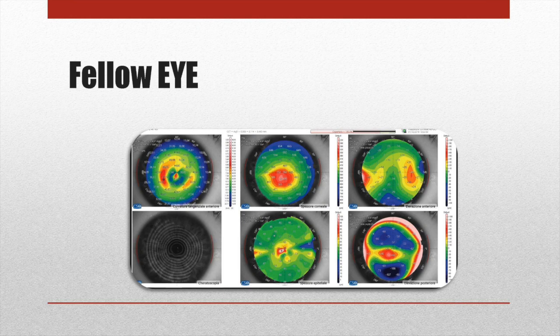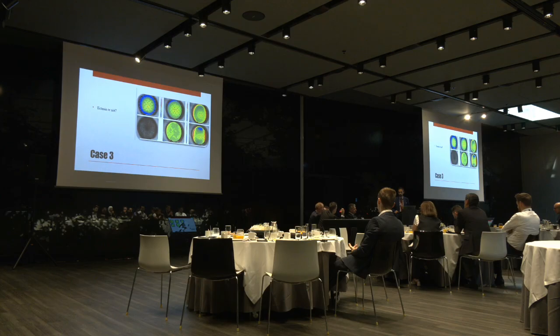Curvature doesn't help you much with the astigmatism, because the nice thing of elevation is that when you have astigmatism, it's depressed. But elevation is referenced, especially if it suffers from angle alpha. You know how much elevation suffers from angle alpha. And the software tried to account for the tilt, yet it suffers much more than the curvature. That's the only reason why I always say if you look at both, it helps more than looking at the anterior elevation, for instance, which I don't think would ever add any information.